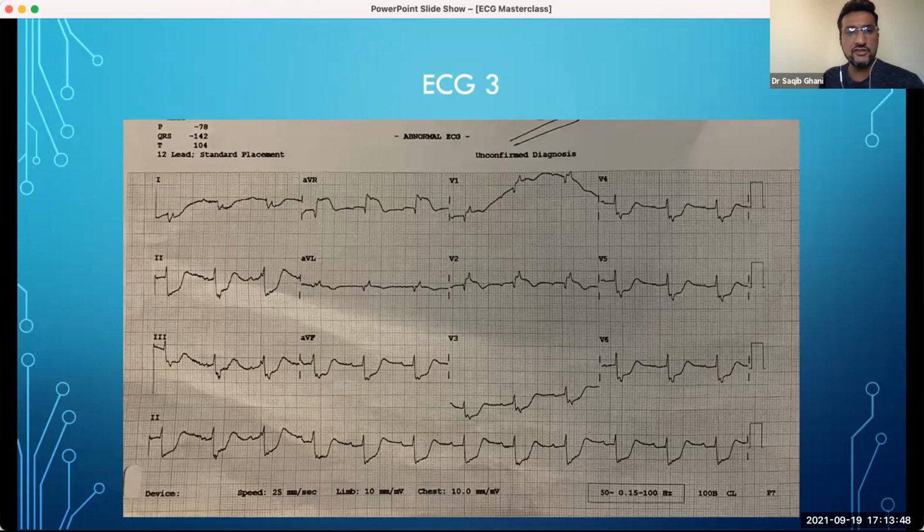In a 12-lead ECG, there are 6 limb leads and 6 chest leads. The 6 chest leads and the 5 limb leads, which are 1, 2, 3, and aVL, aVF, are territorial ECG leads. What about aVR? aVR is like the 12th man in a football team or a cricket team. It doesn't do much, but when it is brought onto the field, when it becomes active, you think something big has happened. So when you start to see ST elevation in aVR, that often is a sign of left main stem disease.